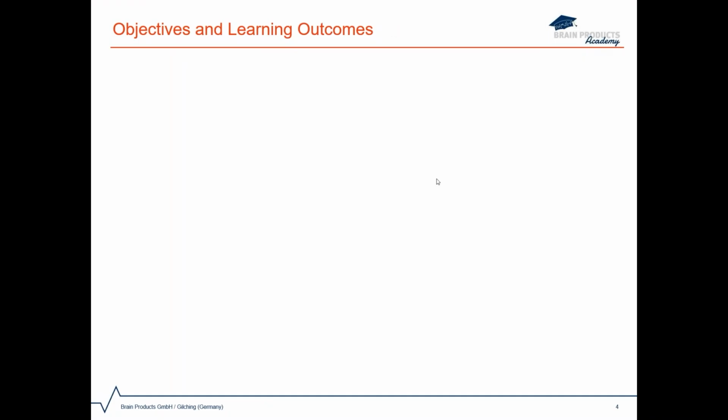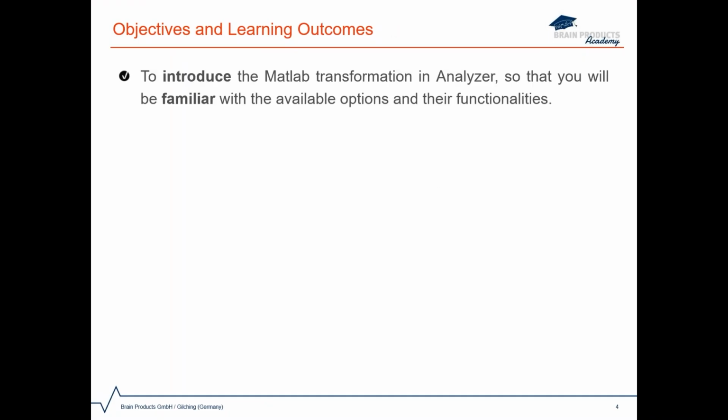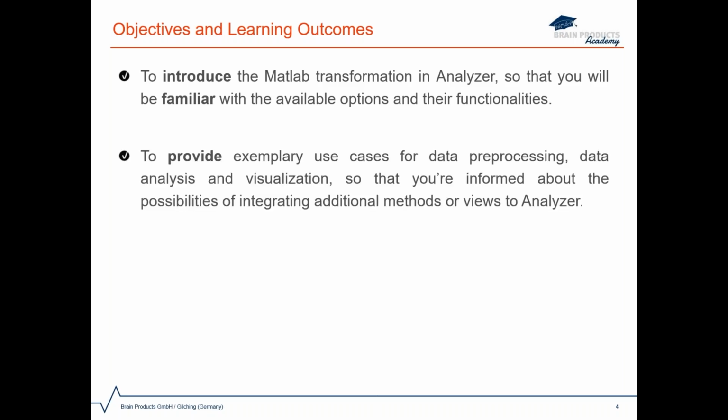In this webinar, we would like to showcase a valuable feature of Analyzer 2, the Matlab transformation. We will go through Analyzer's Matlab dialog in detail so that you will be familiar with the various options and their functionalities.